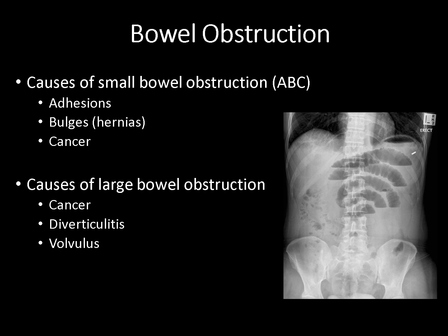And that is a defect in the abdominal wall with some intraperitoneal contents herniating through. And if that is going to cause an obstruction, it typically occurs at the neck of the hernia, where that defect in the abdominal wall pinches down on the bowel that traverses through the hernia, and that causes a mechanical obstruction at that level. And that can occur as the bowel enters the hernia sac or exits the abdomen, as the bowel comes back into the abdomen at the neck of the hernia sac, or it can happen at both of those points, causing a closed loop obstruction within the hernia sac.